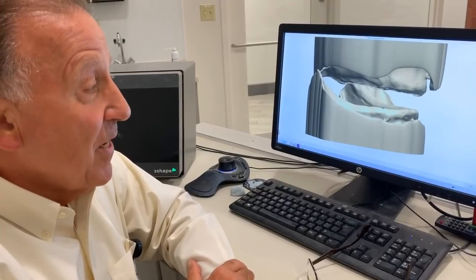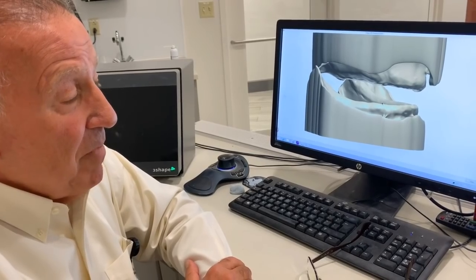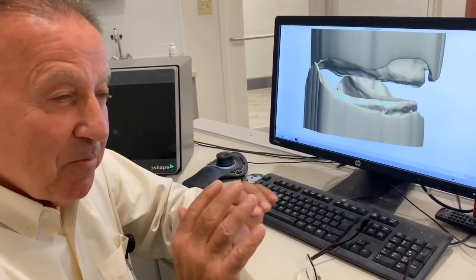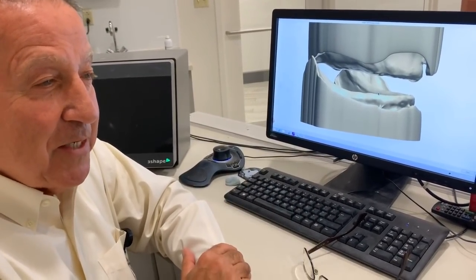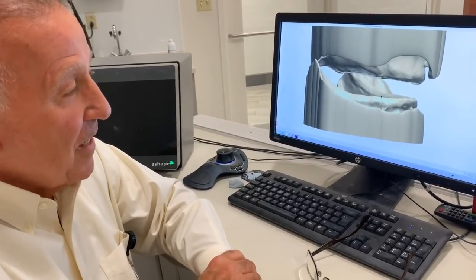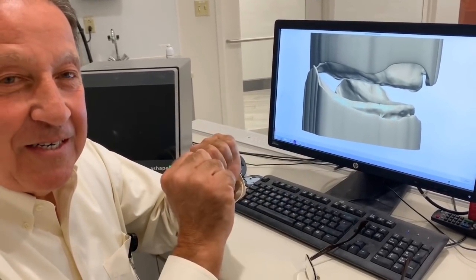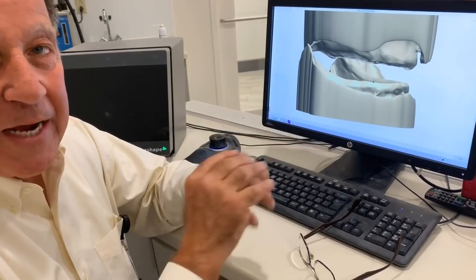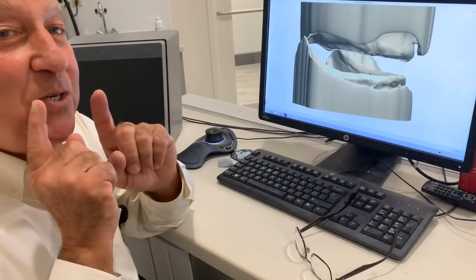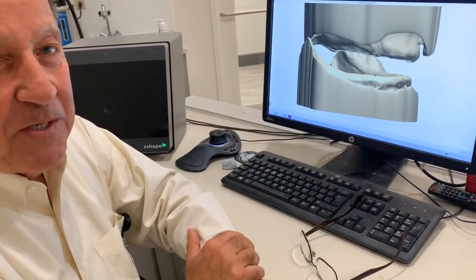That is kind of a nice feature, even for dentists to realize that after maybe a challenging patient, where it's hard to really get it to look right, and they have to do multiple try-ins. But once you really get the teeth in a relationship that makes the patient satisfied and fulfilled, then it's just kind of nice. I just have to get it right one time. Because once it's right, then we could always keep that and always refer right back to that. And if you looked at it and said, I like everything, but boy, I just wish that one tooth was a little bit different, that's no issue. Come right back electronically and just make that little bit of change.